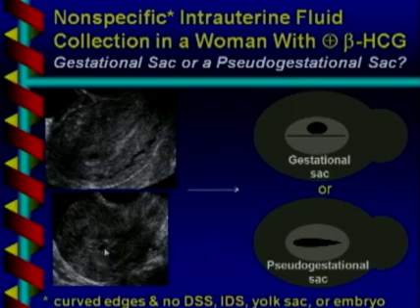So when you look at them, one question might be, is this a gestational sac sitting here outside of the uterine cavity, which is a collapsed cavity, or is it just some fluid inside the uterine cavity, a so-called pseudo-gestational sac? It makes a very, very big difference.